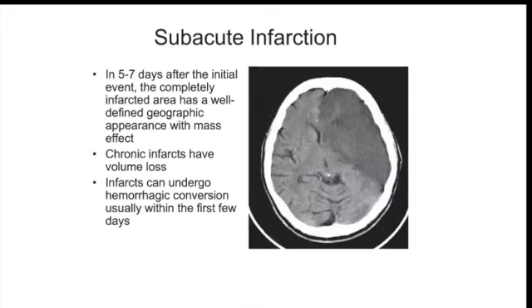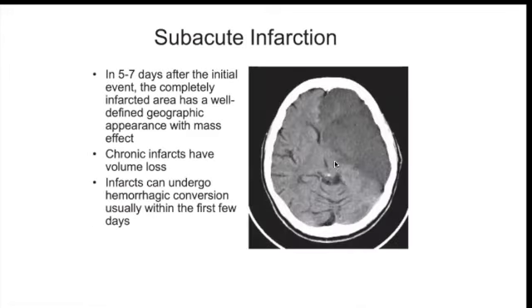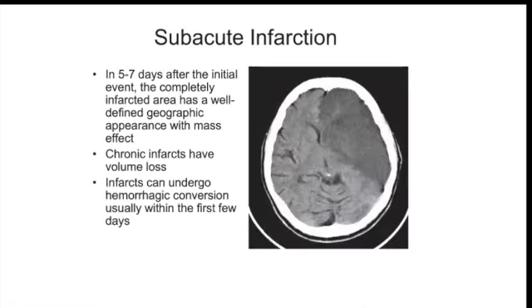And let's proceed from here. So this patient here, they say they have a subacute infarction. So the difference between the image before this, the one with the normal infarct, and the subacute infarction, is that the subacute infarcts are well defined. We can easily identify which area is infarcted. While here, the borders are not really uniform in a sense, okay?